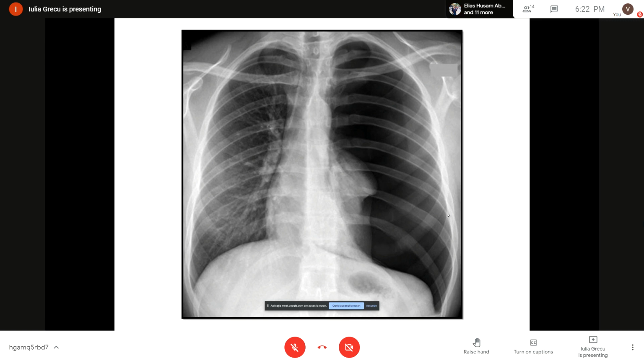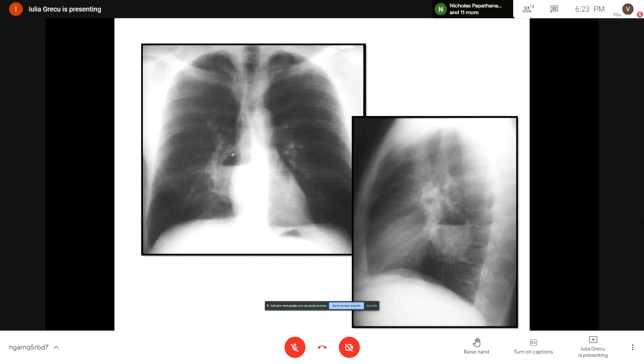In this situation, we deal with a massive pneumothorax that collapses the left lung around the left pulmonary hilum. This is the lung here, and all this is free air in the pleural cavity, which gives us this impression of great hyperlucency compared with the right lung. And in between them, there are the mixed images, which are composed of an opacity and hyperlucency.